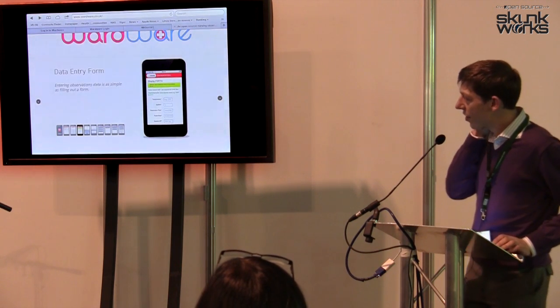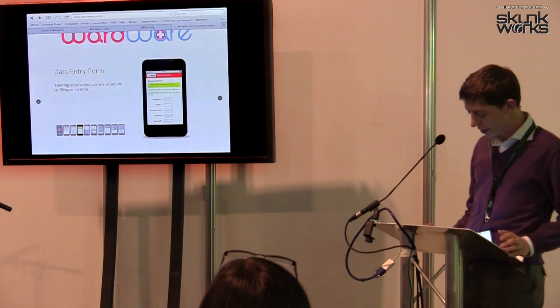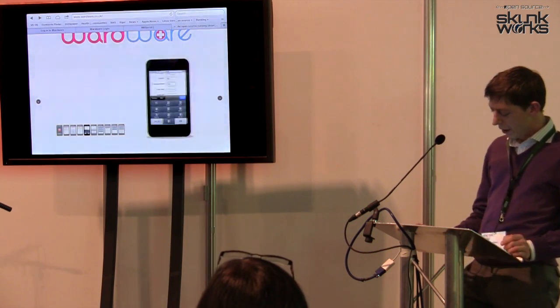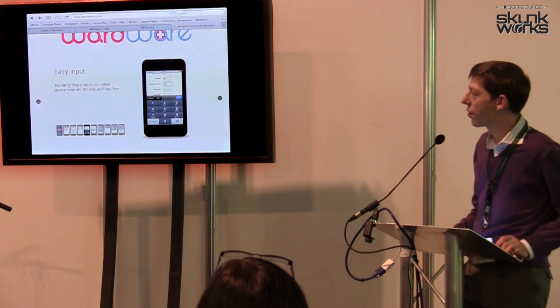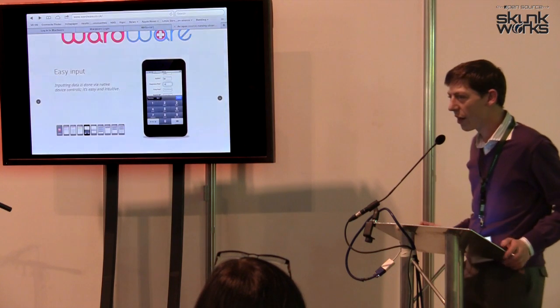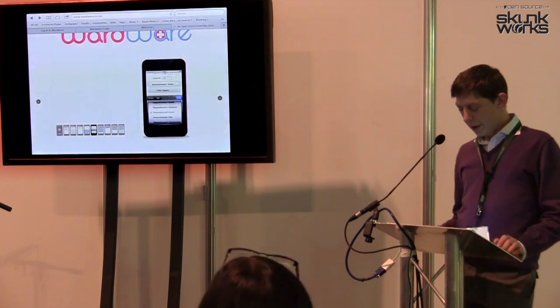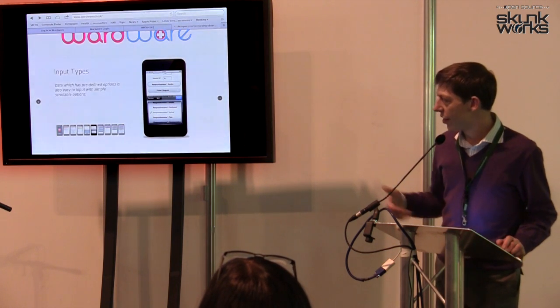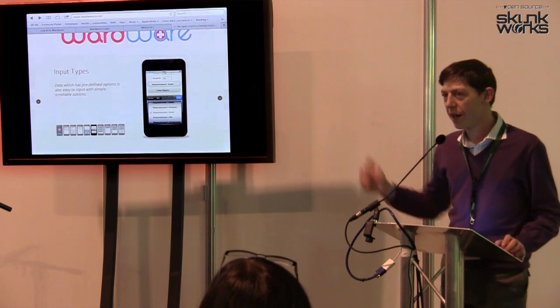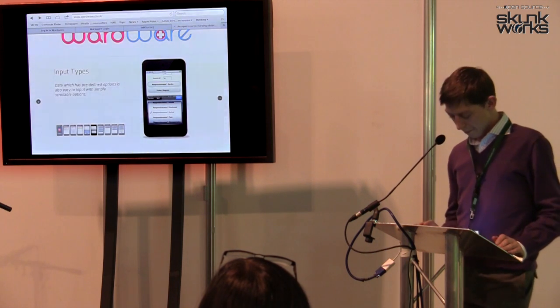As you can see, it's a web app. We have a couple of boxes. We type in some information using all the native controls on the device. So we have the pop-ups there for entering any numeric values for the obs. And where we've got a scroll list, again, it just uses the standard scrolling mechanisms that either your Android or your Apple device will have for a list like that.